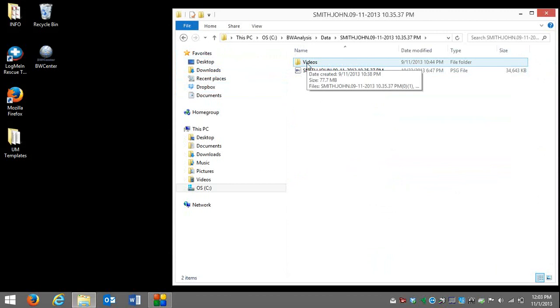And the video subfolder contains the synchronized videos. The videos are in AVI format, so we can play them via Windows Media video player, and we can also view them in the BW analysis software.